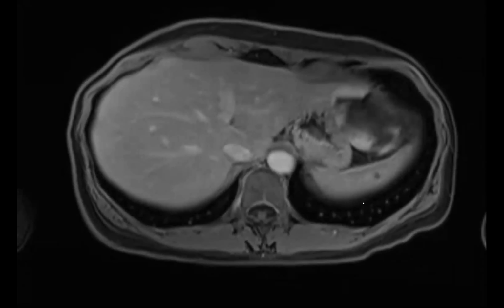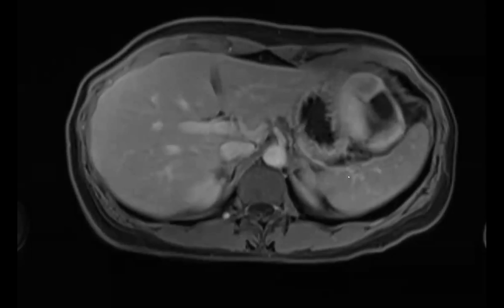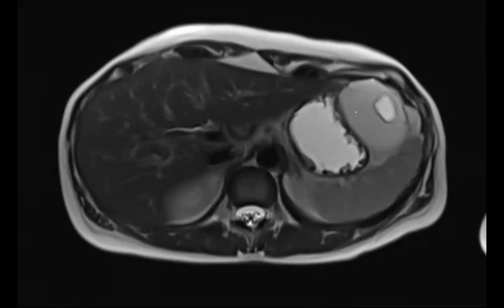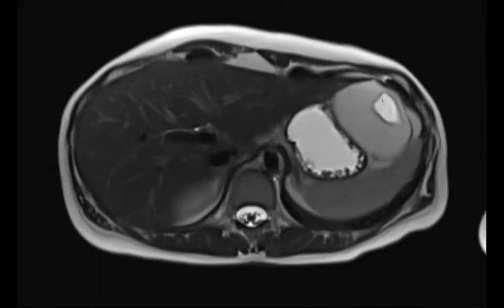Okay, so this was just a cute fake-out, in that this was a hemangioma. The T2 is very classic. Kedar got it immediately. Very bright. And then this more central fibrotic scar is even more T2 bright. That's very classic for a bigger and bigger giant hemangioma. And even though it looks like it comes from the stomach and it looked like that on EUS, it's actually just arising from the left tip of the liver.